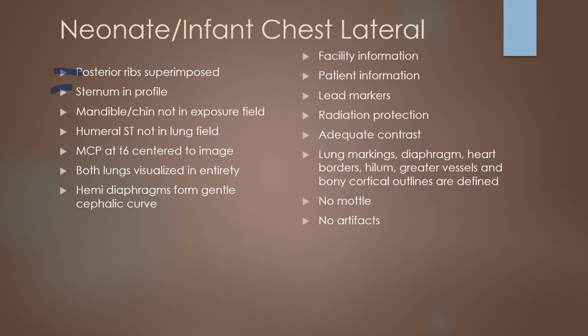Mandible and chin not in the exposure field. That's determined by head position. Humeral soft tissue not in the lung field. That's arm position. Mid-coronal plane at about T6, centered to the image. That would be our central ray placement. Both lungs visualized in their entirety.